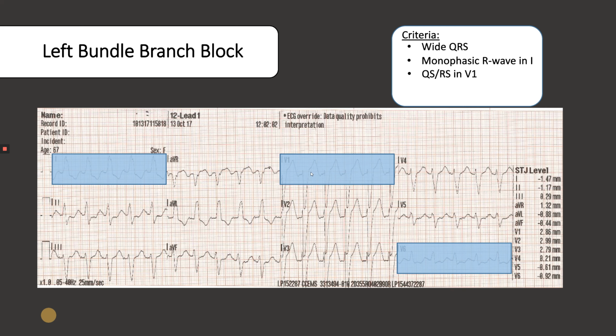Now, one of the shortcuts you'll read about a lot, especially in emergency medicine books, is the turn signal shortcut. This is using the J point. Okay, once you find the J point, I look back at the QRS. If I go down, then it's going to be a left bundle branch block. So you imagine your car, and when you're driving, you hit the turn signal down. That is a left turn. And so because from the J point going backwards, I go down, it's a left bundle branch block. Okay, so that's one of the shortcuts you can use to remember that.